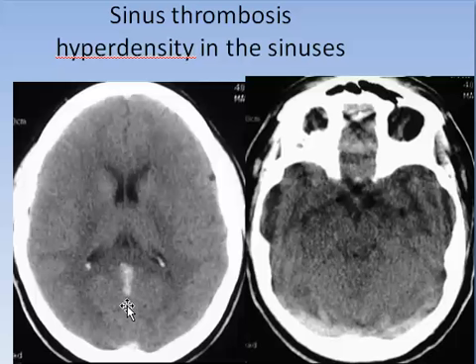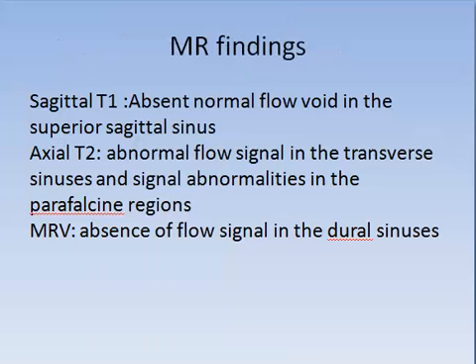Hyperdensity in the straight sinus, sinus thrombosis, hyperdensity in the transverse sinuses.